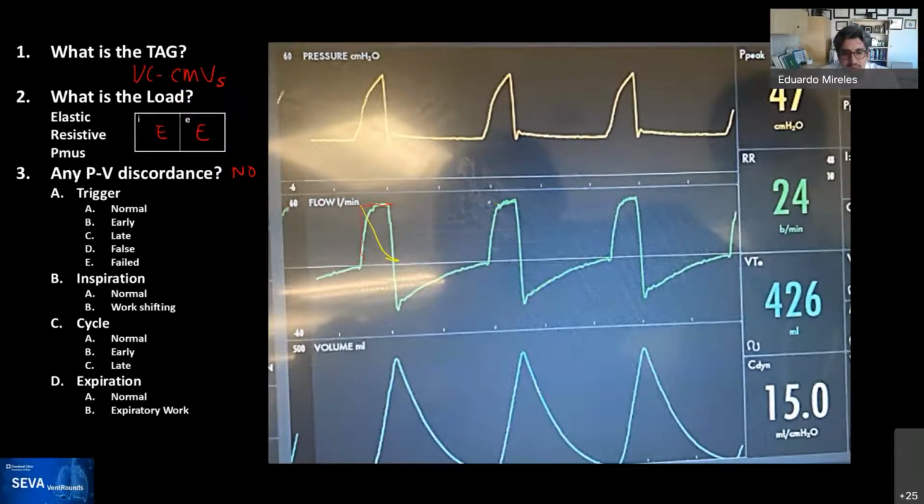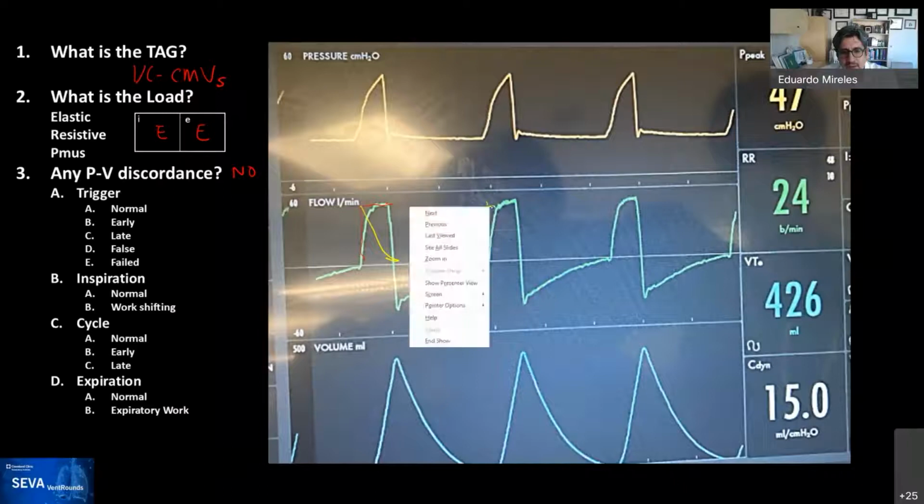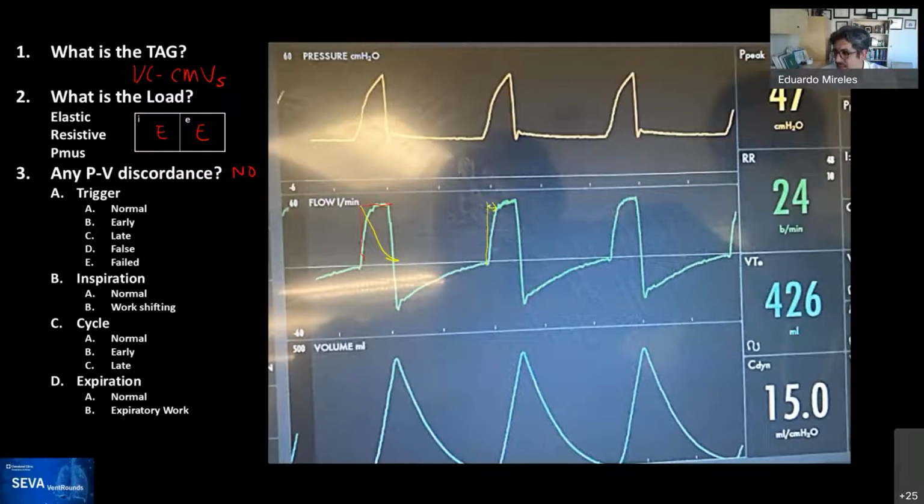And instead of going straight up, which would be the fastest way, they put a little bit of delay on the time it takes to reach peak, which makes no sense, no difference. This is something that was just programmed. So that's why the curve doesn't look like a square as you would expect. Somebody set that up. Okay, does that make sense, Udi?